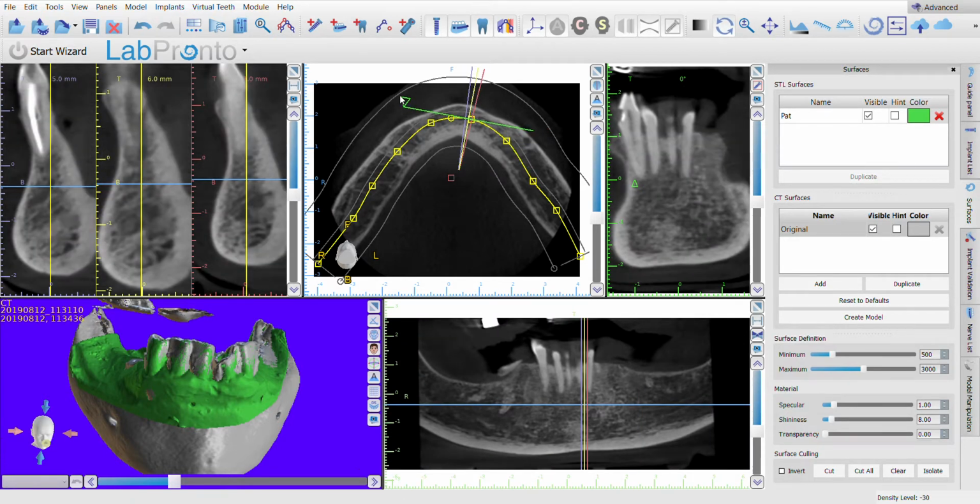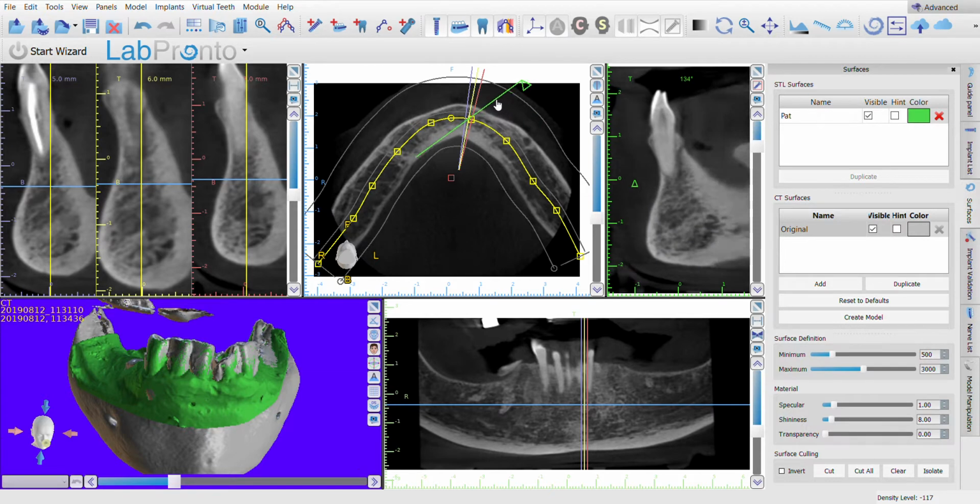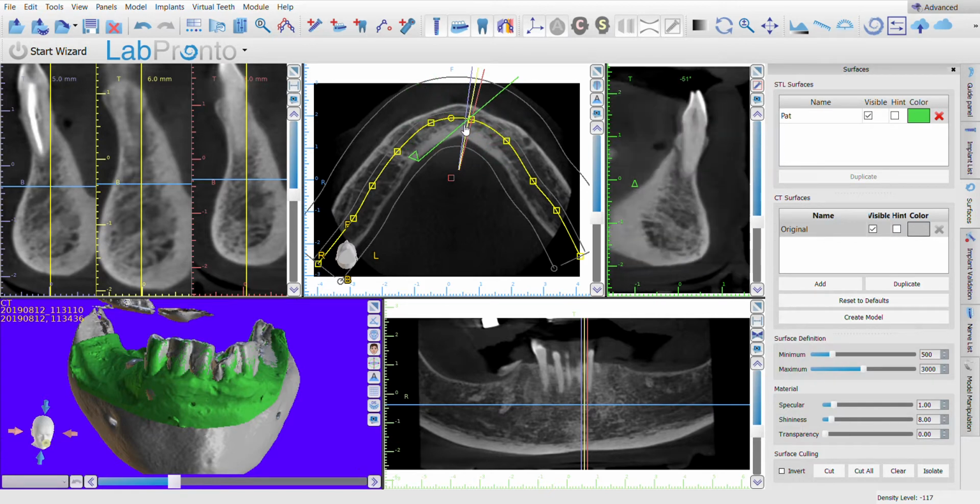The last image that I wanted to show you is our tangential. Okay, and the tangential is this green stick that you see on the axial image corresponding to this green. So if you get confused about what these colors correspond to, this is how you can indicate to yourself and understand where you're at. If I take this tangential, you can rotate around in 360 degrees on the axis of whatever you're looking at.